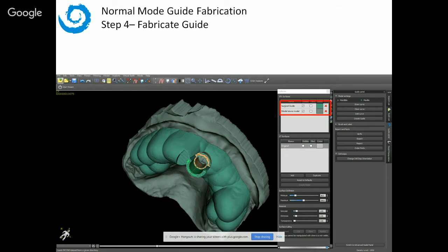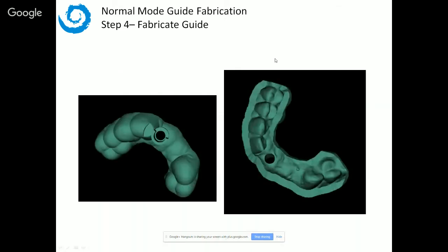This clearly shows that the surgical guide is fabricated exactly according to the treatment planning that you did. Okay, there's no difference, there's no discrepancy of any sort. The hole in the surgical guide is exactly according to the software guide tube. The part coming up from the brown software guide tube, again, is your built-in drill stop. And that's going to control your depth with your handpiece. Here's the surgical guide from different angles.